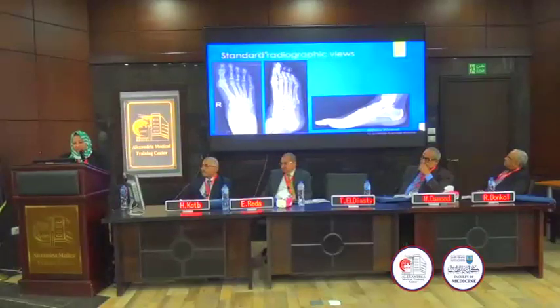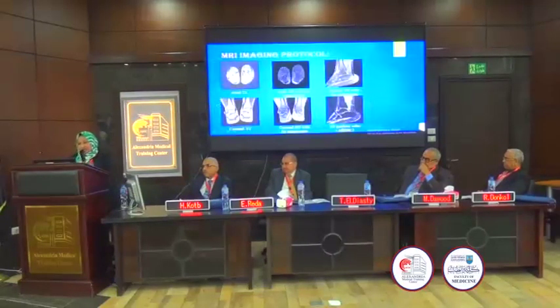Of course, we always start examination of patients with foot pain by the plain X-ray of the foot with the standard radiographic views: posterior-anterior, oblique, and lateral views. Usually we proceed to the next step, which is the MRI, using different imaging protocols.